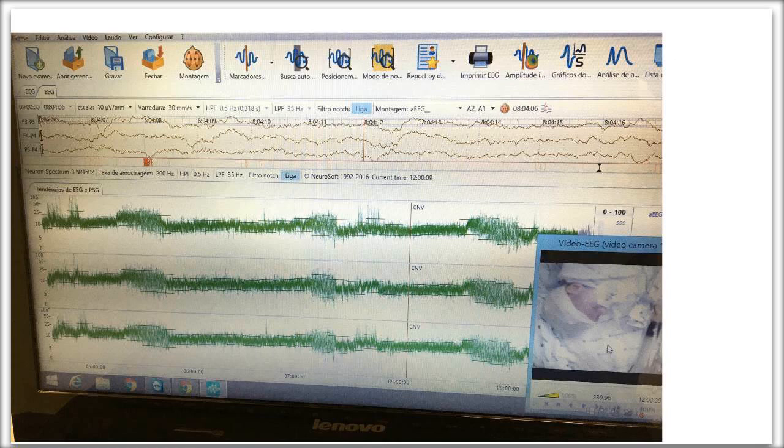And one of the things that was concerning, or just of a question that Gabriel brought up, was whether or not it's normal to see these margins of the EEG to be so high. So, seeing this aEEG be kind of at 10 for the minimum and more like 25 for the maximum. And I noted that I do see this from time to time, but mostly in older babies, not always in babies who are just right at term or 41 weeks even.